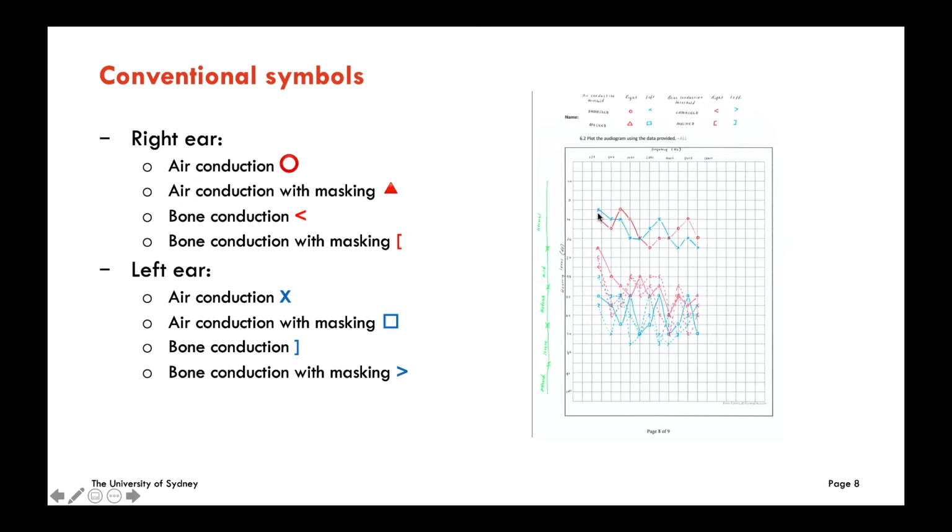Looking at the left ear, again, the hearing thresholds range from 5 decibels to 25 decibels as the frequencies increase. And once again, air conduction in this person is within normal range, which is below 25 decibels. So you can say this person has bilateral air conduction within normal range. So that rules out conductive hearing loss in this person.